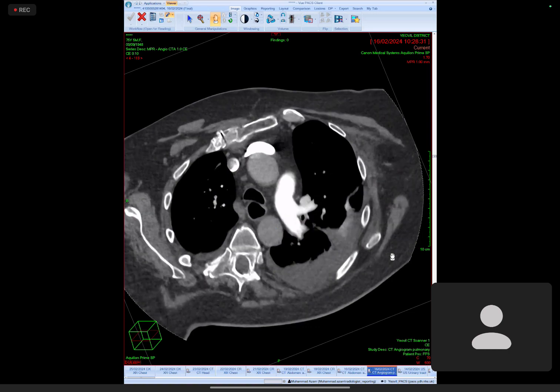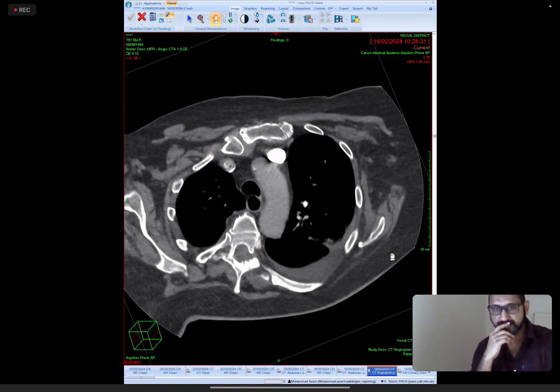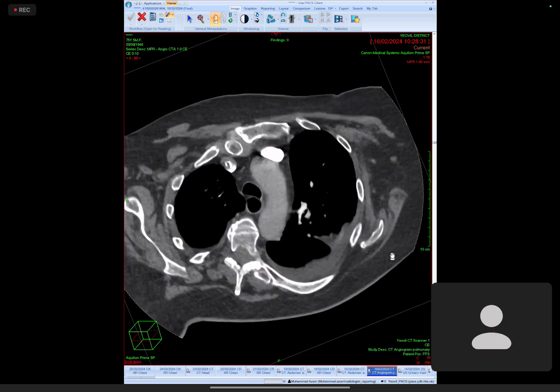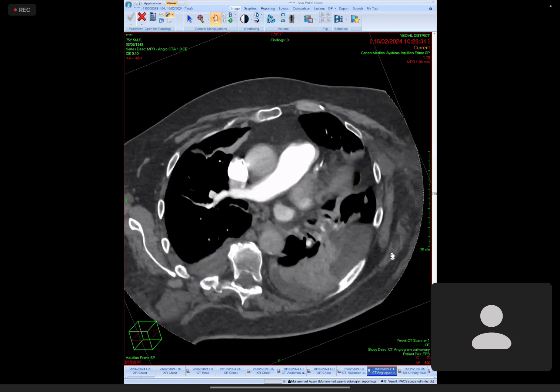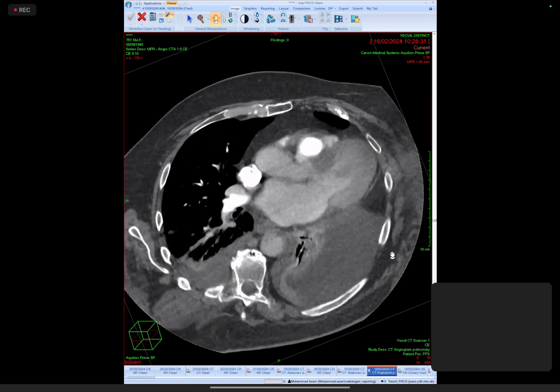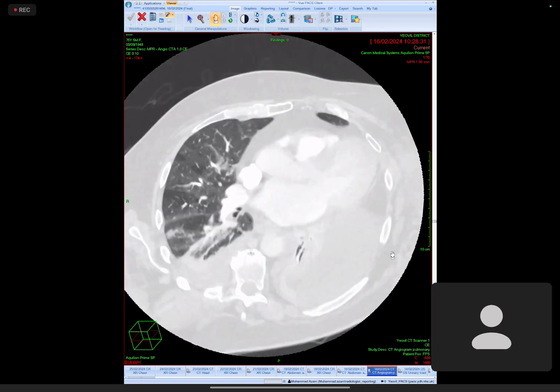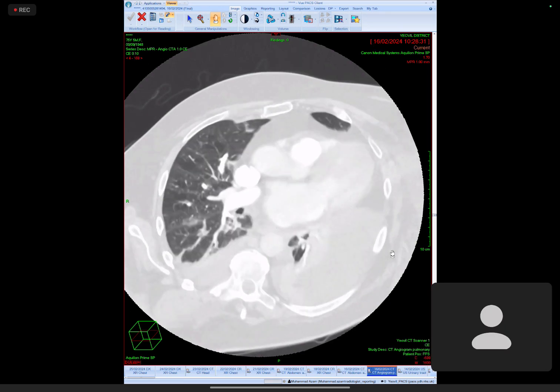Sir, can I have a look at the lung window, please? There is nothing significant in that. In the lung window. So, I guess that there is, sorry, bilateral. Sorry. Yes, sir. Wait. Yes, here we go, the lung window.